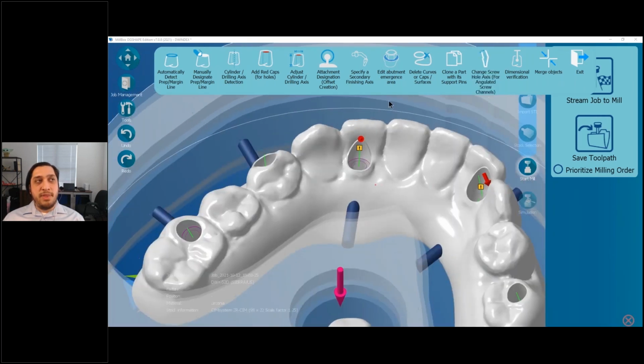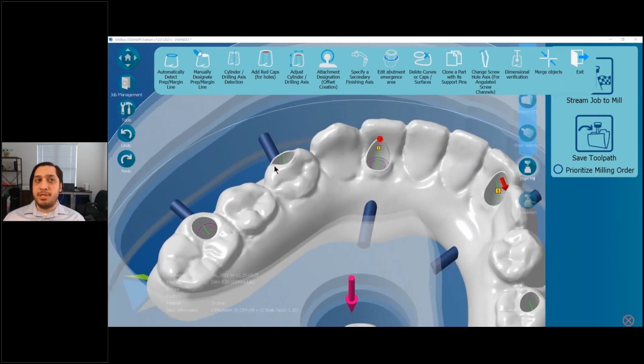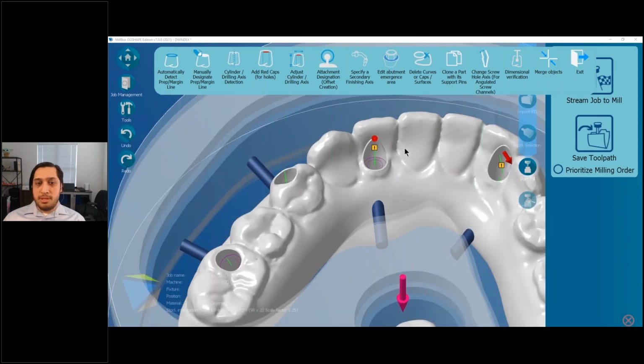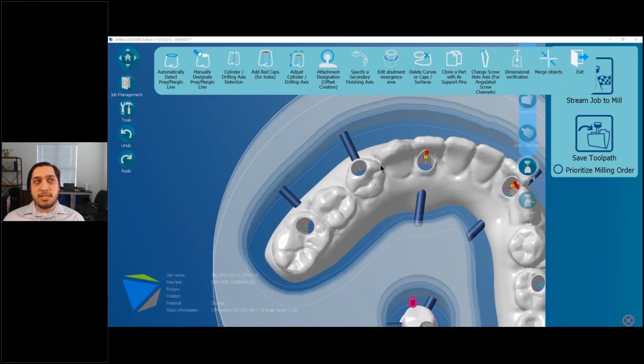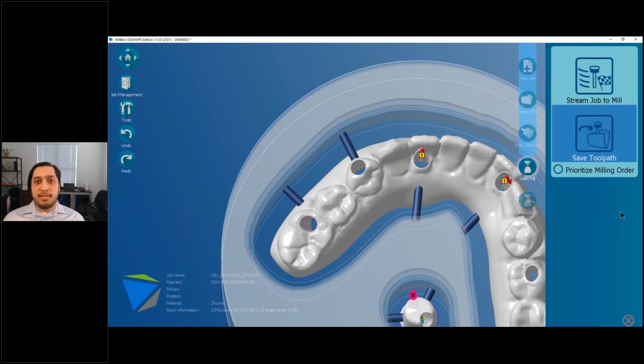But the nice thing is you have an option outside of, oh, you have to redesign it, or oh, you have to re-output your STL file, or you have to use GeoMagic to come in here and edit it with a third-party CAD software. So it's those types of problems that we're trying to avoid, and ultimately that's some of the value that these new updates bring.